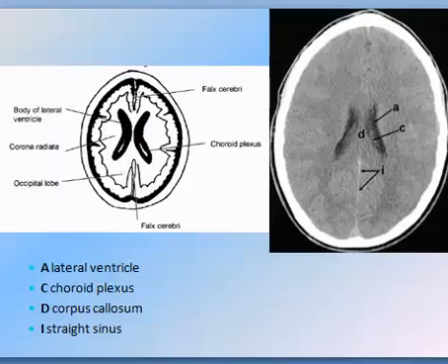Now, this is a high level where the ventricles are getting away from each other. Don't forget that still we have corpus callosum. So the corpus callosum, splenium, and genu are now coming to each other as one mass, and this is called the corpus callosum body. The lateral ventricles are there with choroid plexus inside, and this is the falx cerebri, showing the dense straight sinus inside.